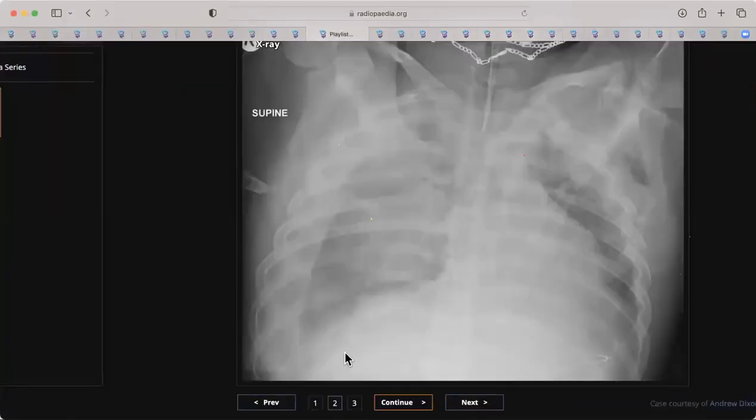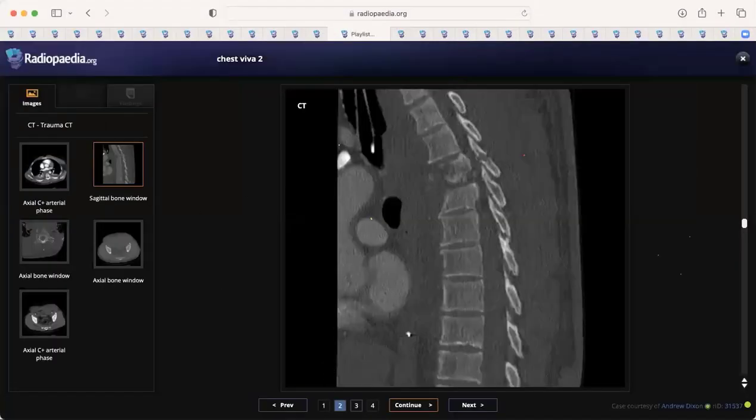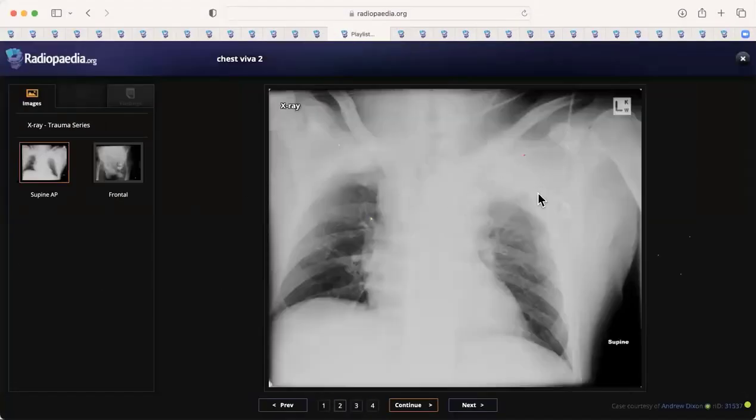That was a case of trauma. It had a lot of findings, but again, this is just how the hemithorax appears. And we've discussed the apical capping. The most important thing when we see apical capping is that we need to be worried about traumatic injury, aortic injury. And this is the second case of another pleural capping with widened mediastinum.